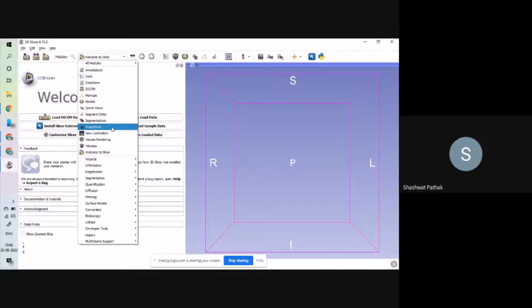This is the conventional 3 one, this is the conventional one. And for the time being, I'll keep it 3D only because the object we'll be studying right now will be only in 3D. Moving on, the volume rendering, this part helps us in visualizing the model that we have loaded and visualizing the data that we have uploaded onto Slicer for analysis.